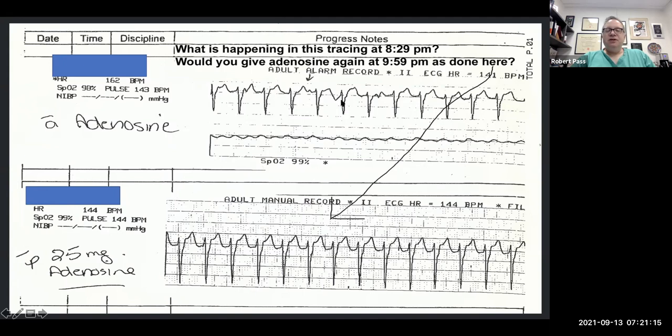This is important because you really want to run the tracing when you give adenosine to anybody, because sometimes, even if the tachycardia doesn't break, the fact that we saw persistence of the rhythm with ventricular atrial dissociation in the setting of adenosine is a very, very important diagnostic clue, right?